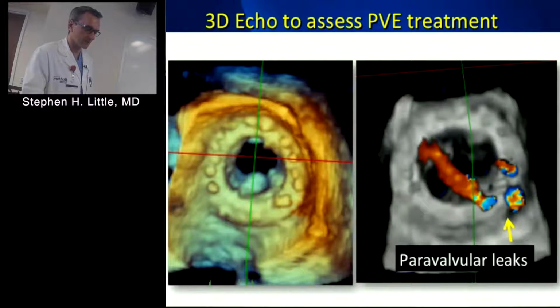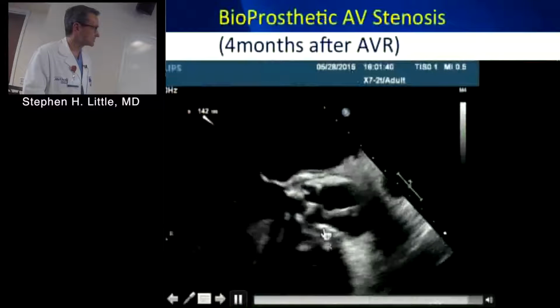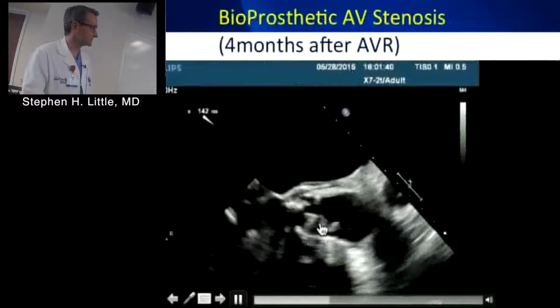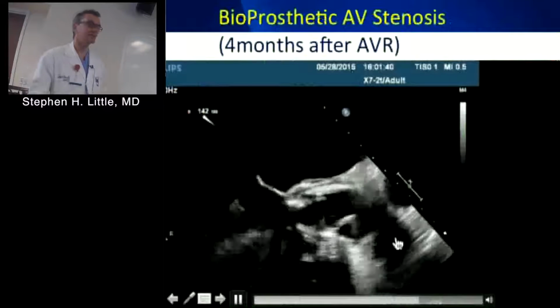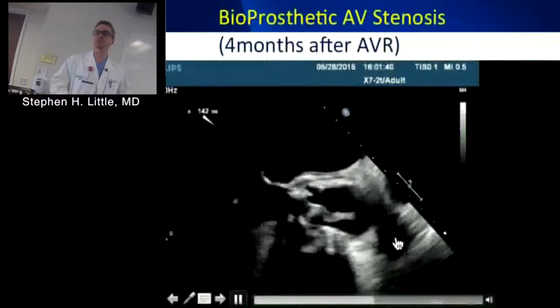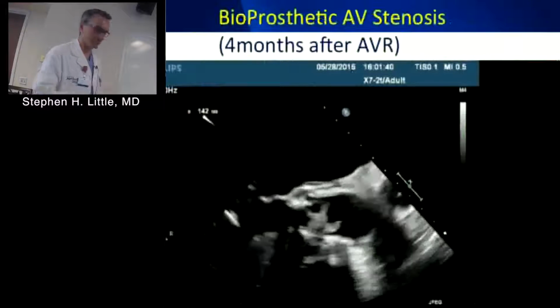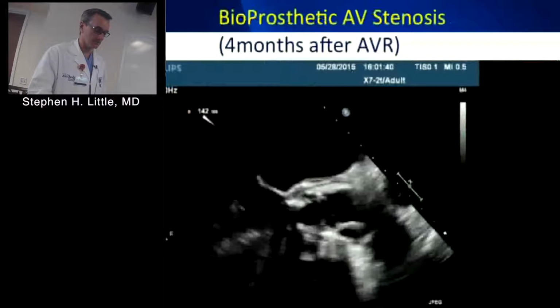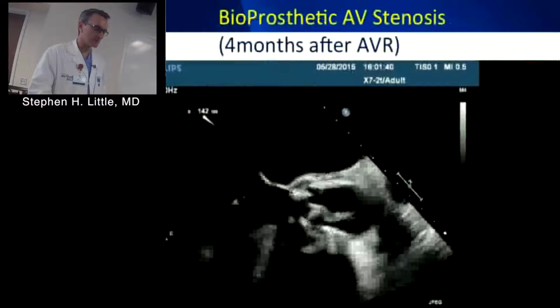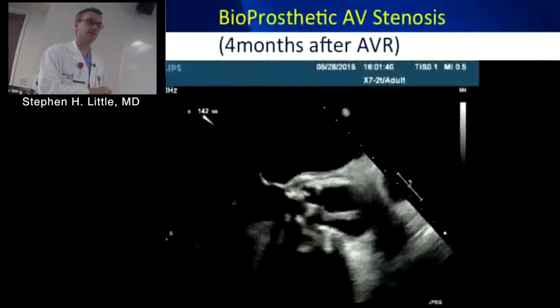This was a fairly recent one, actually. This is a year ago. Here, a surgical valve, and Dr. Q, you were involved in this one. The surgical valve presented with an abnormal systolic gradient, so it didn't present with any embolic event. It came in with a new peak velocity of 4 meters per second across the surgical valve. And then a TEE was done with a high suspicion. I forget what the suspicion was, but nobody was thinking endocarditis on the transthoracic.